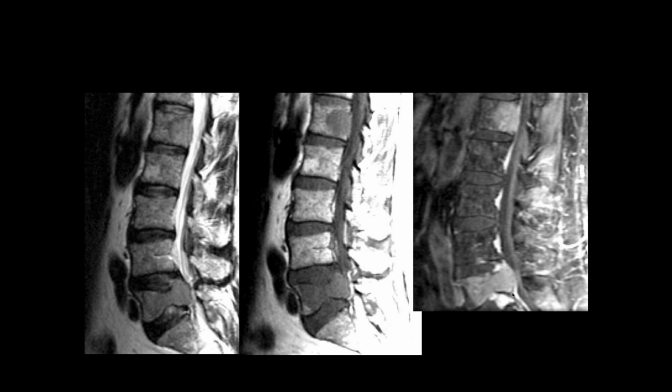With tumors, you get slow destruction of the bone that weakens the cortical and trabecular bone, and then the pressure on it allows bowing of the posterior cortex. In other conditions, such as compression fractures, you'll fracture the trabecular bone here, but the posterior cortex is still pretty tough, and so you will not get the bowing back here. So this is very valuable. And then there are some other signs. Diffusion-weighted imaging can be helpful sometimes, and the contrast enhancement can be mildly helpful, and then obviously the history.